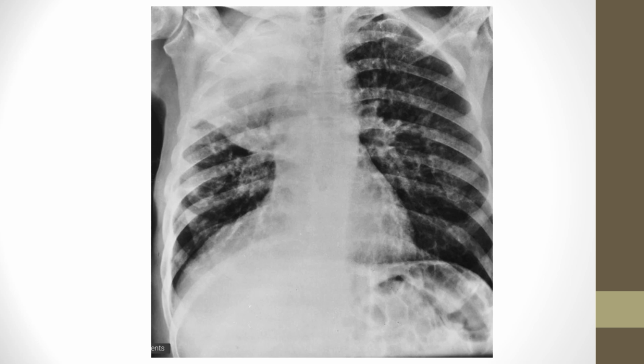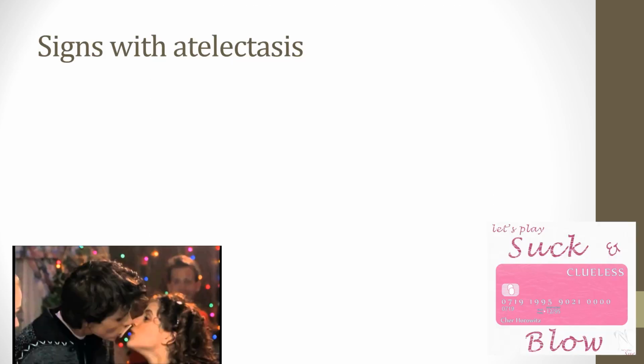Obviously you can see that right upper lobe has something going on. In this patient, they have a tumor that's obstructing their right upper lobe. And remember, most of your lung cancers happen in your right upper lobe, right? So it's obstructing it, and now they've developed a pneumonia that's distal, right? It's pretty bad. It's even developed that boundary, that fissure line. So you can see the right upper lobe pretty much defined in there. That's obviously atelectasis of the right upper lobe, secondary to a lung tumor.